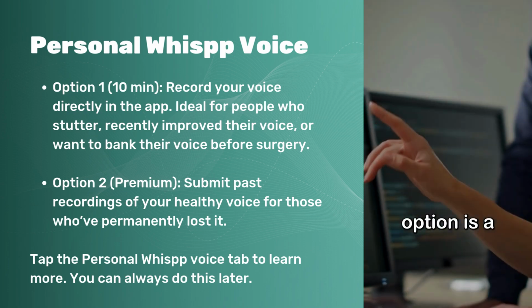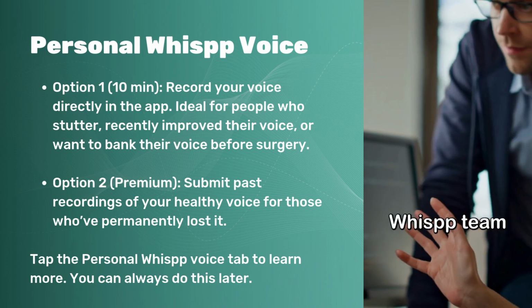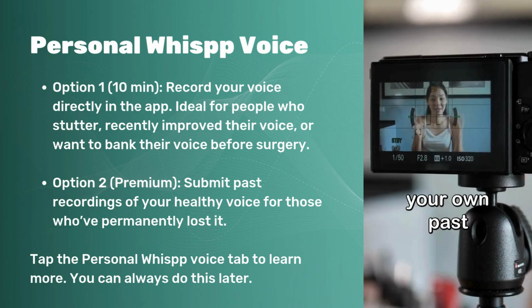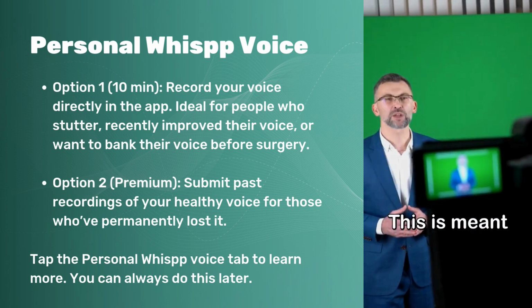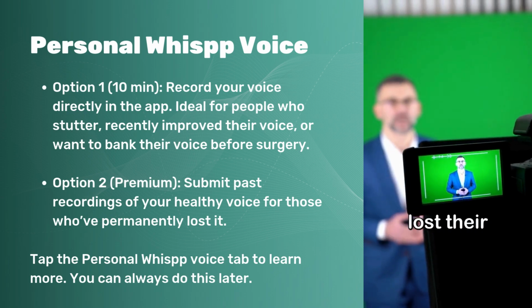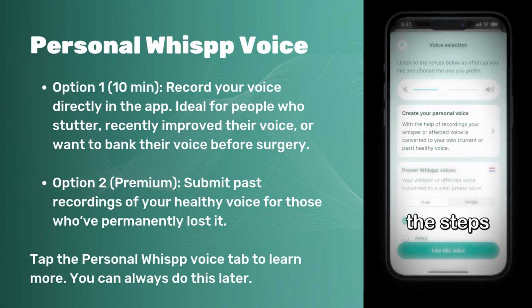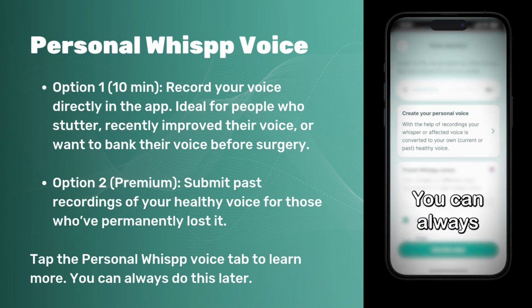The second option is a premium service by the Whisp team for which you need to submit clear audio or video recordings of your own past healthy voice. This is meant for people who permanently lost their voice. Press the Personal Whisp voice tab and follow the steps to learn more. You can always do this later.